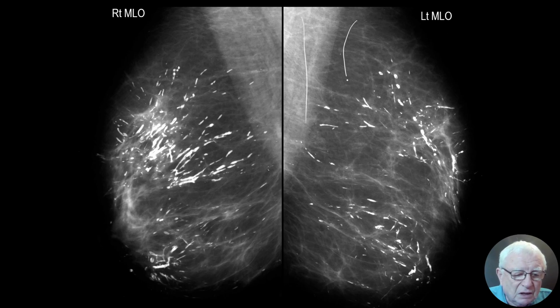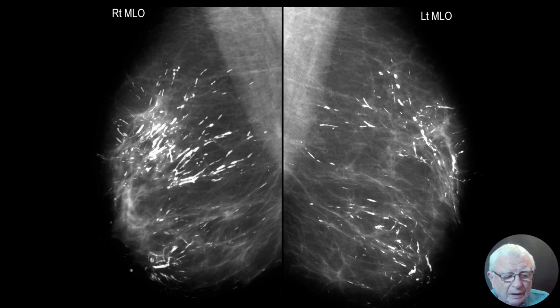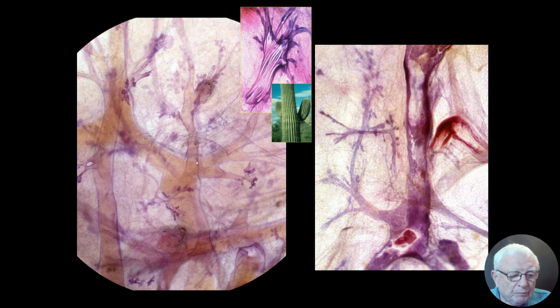If you see these needle-like calcifications localized only to one breast, only to one lobe, don't look at the shape density. Think this is carcinoma. The benign is always bilateral, harmonious. You see, this is when the fluid petrifies, and that's what we were talking about. The normal duct system has the terminal ductolobular units, but the newly formed cancerous duct doesn't have TDLUs.